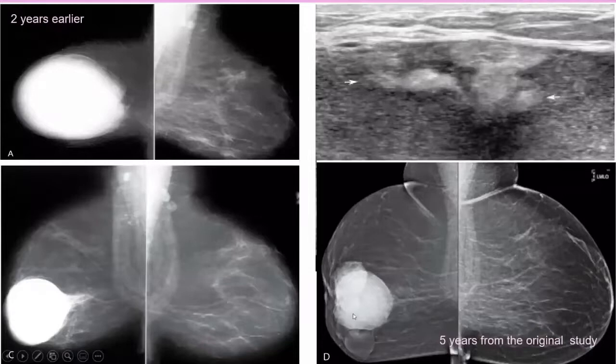Are one or other lesions seen in the vicinity? Two nearby lesions. What about the new lesions seen in the vicinity, same characters or different? It seems the same lesions with less density, also circumscribed.